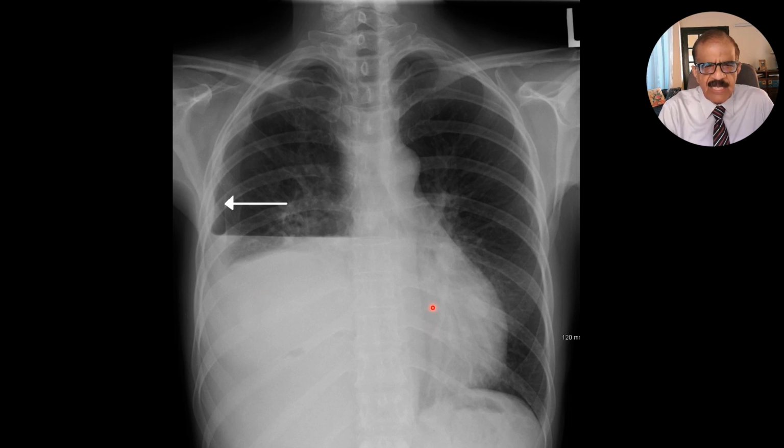And in this case, I do see some impression that the midline structures are slightly pushed to the opposite side. At least the heart is; the trachea appears to be in its normal position. So the diagnosis in this X-ray is moderate hydropneumothorax. Now let's move on.